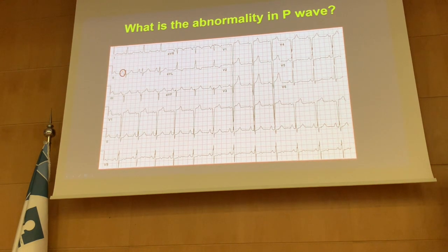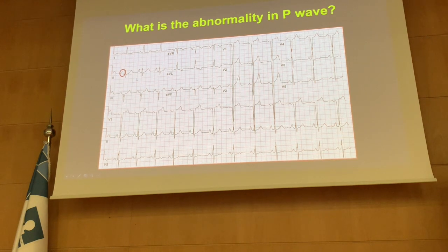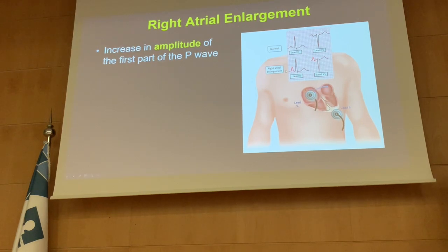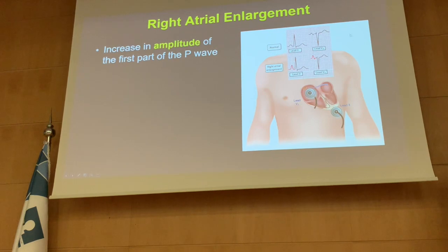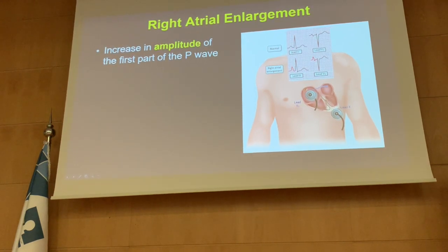Okay? So this patient has big P wave and nothing wrong in the V1. That means he or she has right atrial enlargement with the scenario. You have to read the scenario. So this is a summary. This is normal ECG, and this is a very big right atrium.